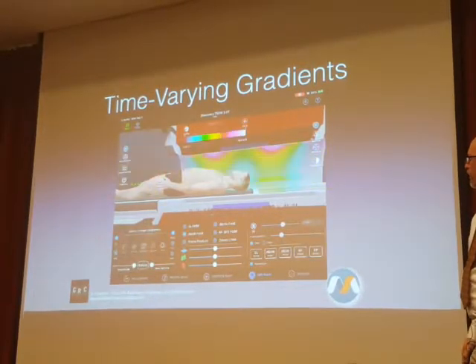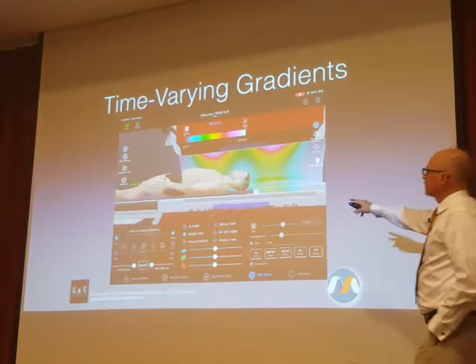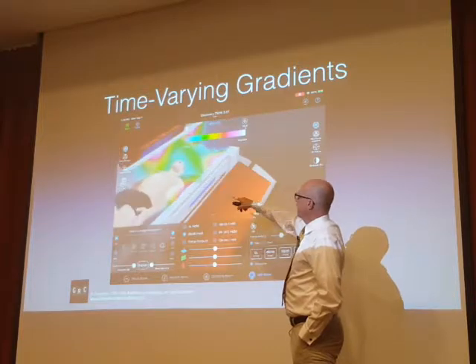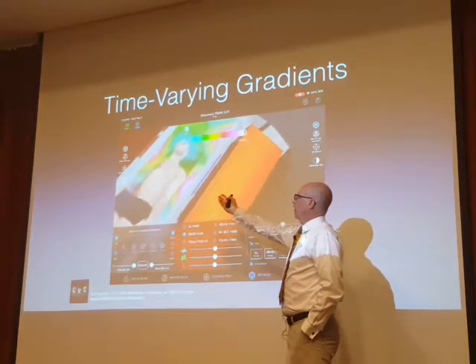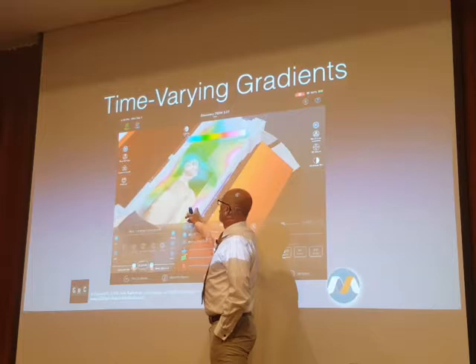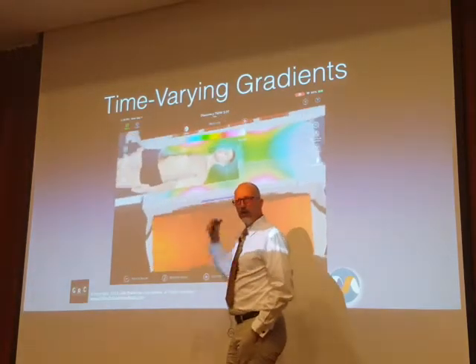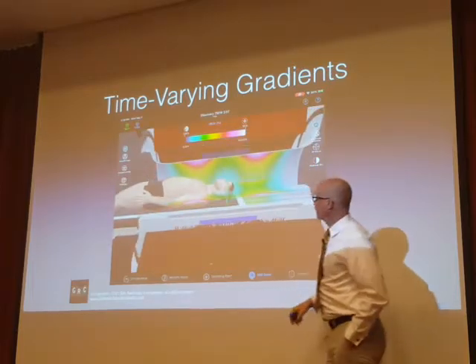So we'll turn on spatial gradients. And these are cutting planes. There's an X and a Y and a Z cutting plane. So again, it's radially symmetrical. So what you see on the side here wraps all the way around the tube, all the way around the inside of the bore.